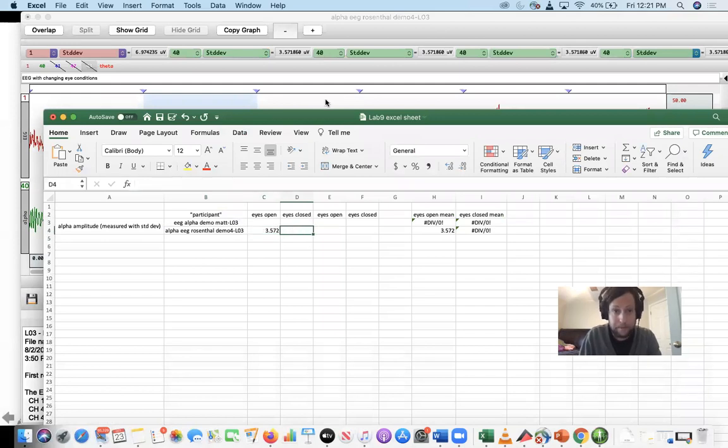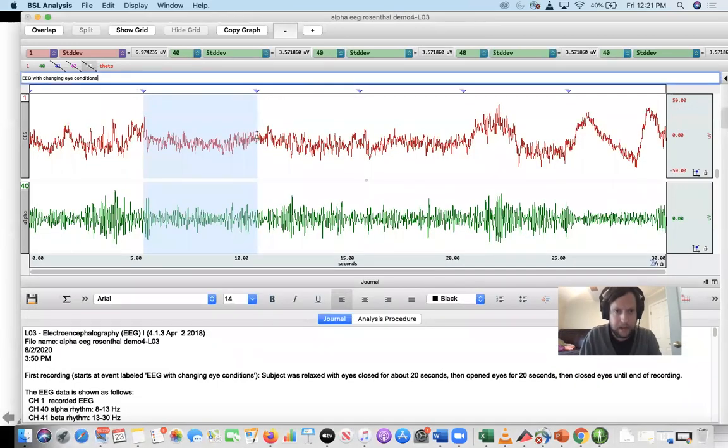And then we'll do the same thing for all these others. So let's do it again. Now we're at the first eyes closed trial. Once again, we don't care what's going on in channel 1. All we care about is channel 40, which is where alpha is. So for the eyes closed, that was 4.275.